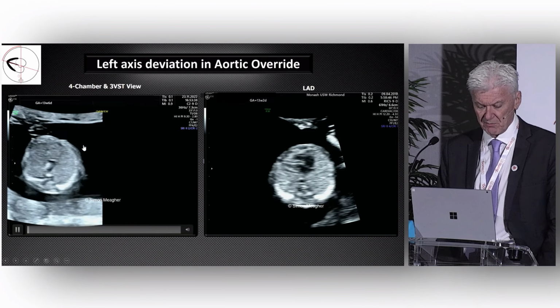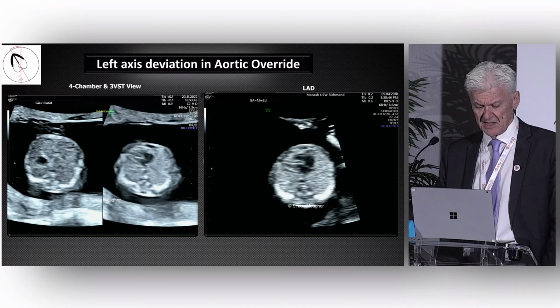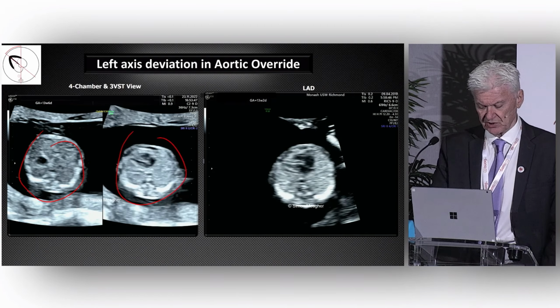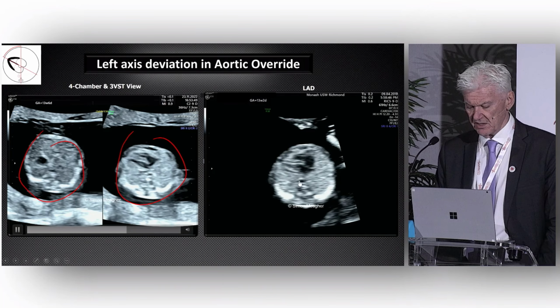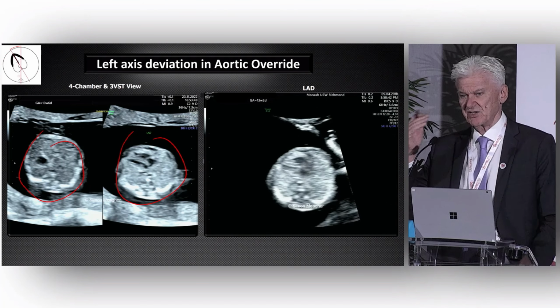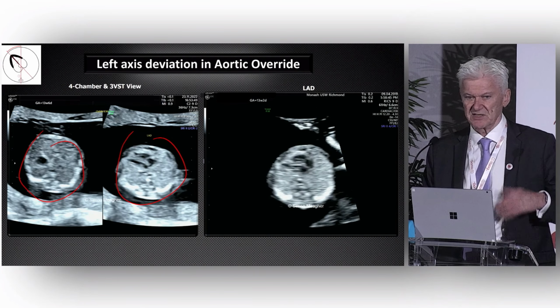So you go to work tomorrow morning. For every examination you do, golden rule number 5 or 6, whatever it is, you do a split image showing the stomach, and then you do a split image showing the 4-chamber beside it. When you compare one against the other, you appreciate that there's axis deviation. It's that important systematic approach for every examination that you do a split image, and then you instantly recognize that there's axis deviation present.